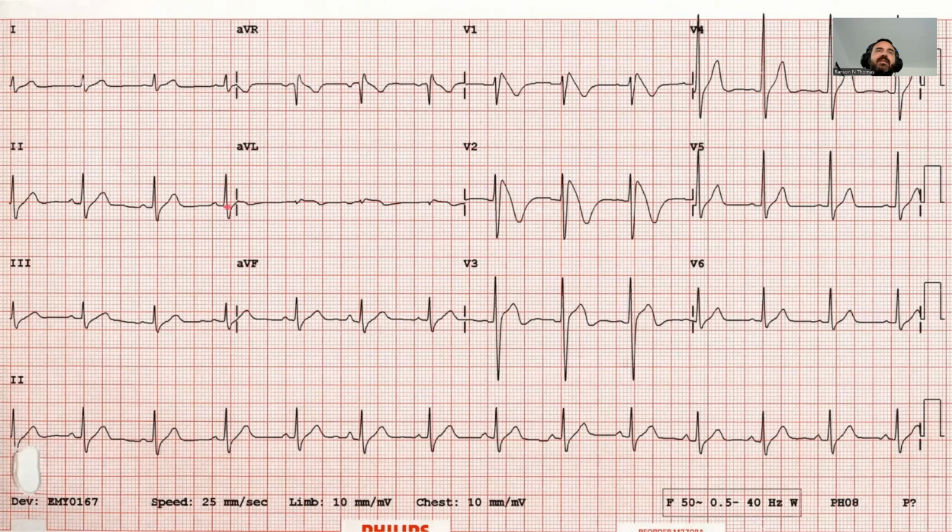Now, it might be sometimes hard to see, right? So for example, this one, it's kind of hard to find the P wave. It's kind of hard to find even any of the waves. But if you look at some of these others, this looks radically different than this. However, you can still measure the waveforms, right? Same thing here. Generally, though, the 2 lead is what we use, and that's why we default to it. It's probably way too much information. Sorry if I spent too much time on that, but just so you're not intimidated.